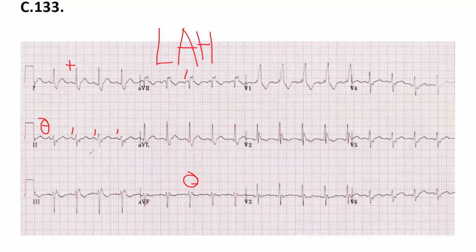Next one, PR interval. It's constant and normal. Good. Next, QRS. Is it wide? I don't think so. No. Oh, in V1, yeah. And everywhere, not only in V1, but in lead number one as well, because here this is a QR interval.